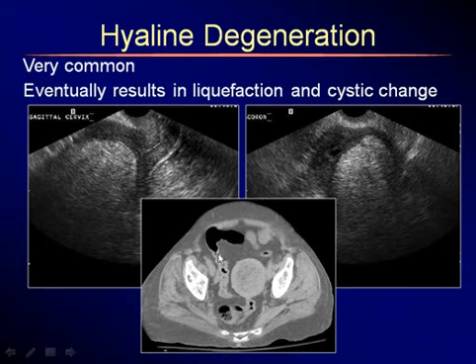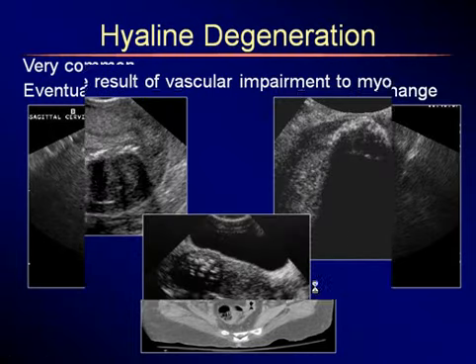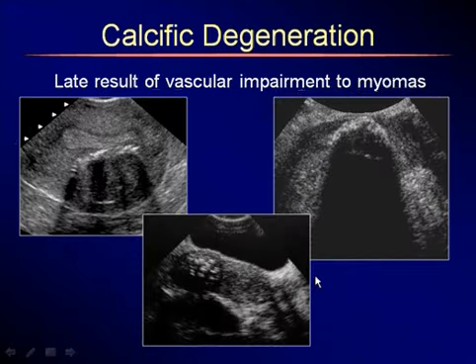So sometimes they can be hyperechoic. They can liquefy and develop cystic change on top of that, and basically are removed only based on symptoms.